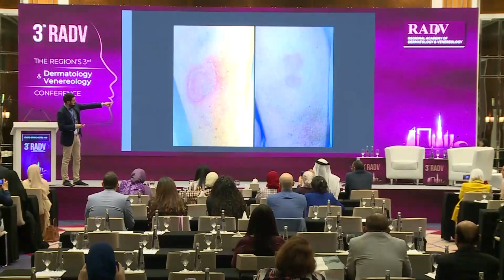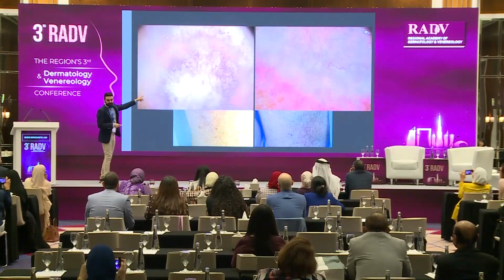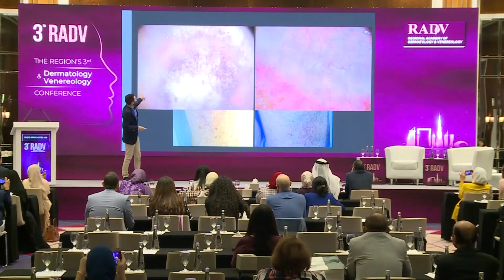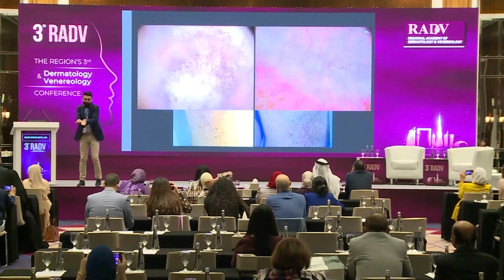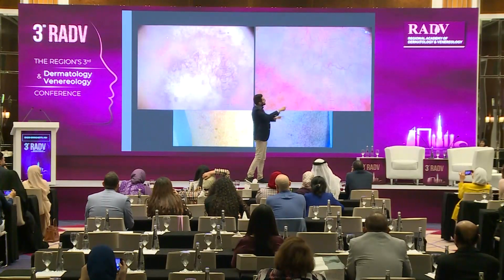So, you said that one. Brava, brava. And this one is the other condition, because we have the reticular vascular pattern and the orange area at the periphery. You don't need dermoscopy. On the other hand, in this case, we have these serpiginous vessels with branches.